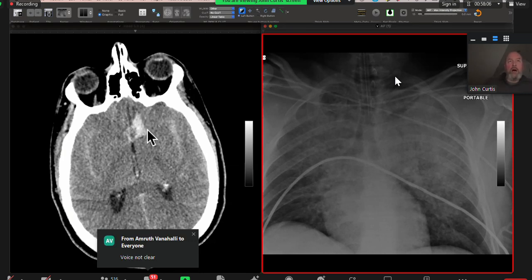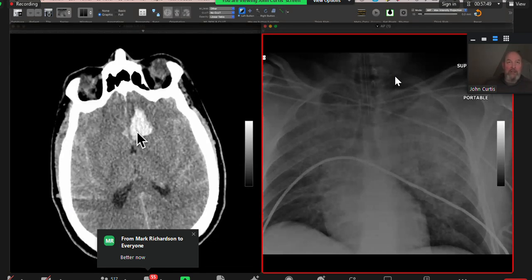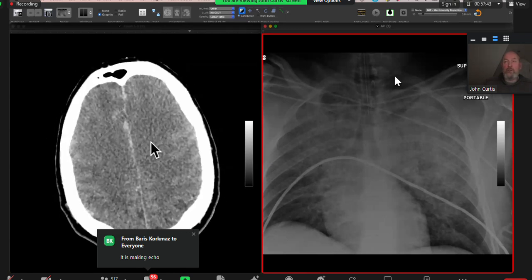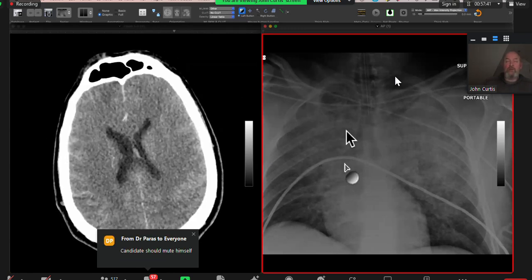Okay, so we've got a hematoma around the anterior communicating artery and anterior cerebral artery, and it's almost always at the junction of an artery and another artery. So the likelihood is that there's an aneurysmal bleed in that part of the circle of Willis. But the consequence is that the patient, who has no prior history of cardiac disease, gets pulmonary edema.